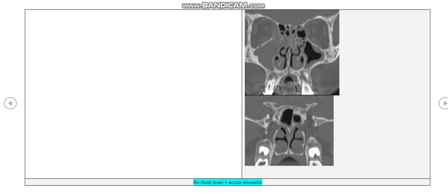equals chronic sinusitis. Okay, so this maxillary sinus polyp can be associated with other polyps or mucosal thickening in the other sinuses or in the nasal cavity. So here, the left maxillary sinus shows mucosal thickening, indicating chronic sinusitis.